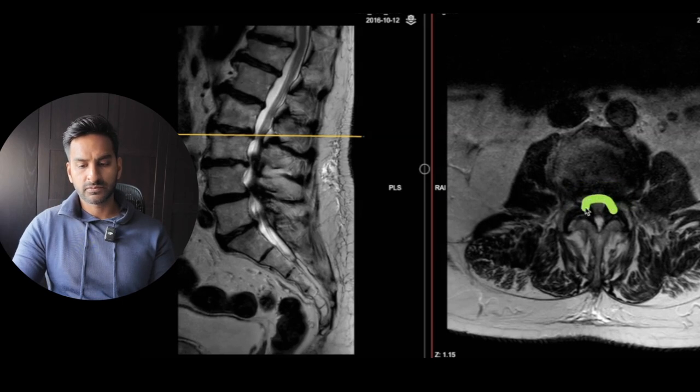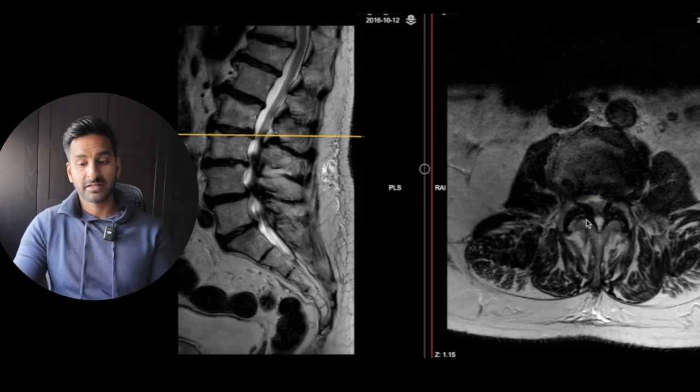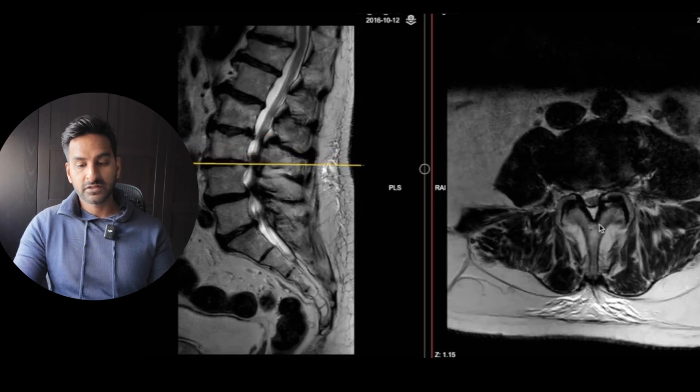Obviously, you've got your circumferential spinal canal narrowing, you've got your lateral recess potential narrowing, and then you've got exiting nerve foraminal narrowing, and then you've got your extraforaminal narrowing as well. So about potentially 3 places of narrowing that can exist. And that's what you have to do. You've got to go to every single level and try and think about what's being narrowed and what's not being narrowed. So you can see on this level, the next level, that's L5, L4, L3, there's L3/L4.